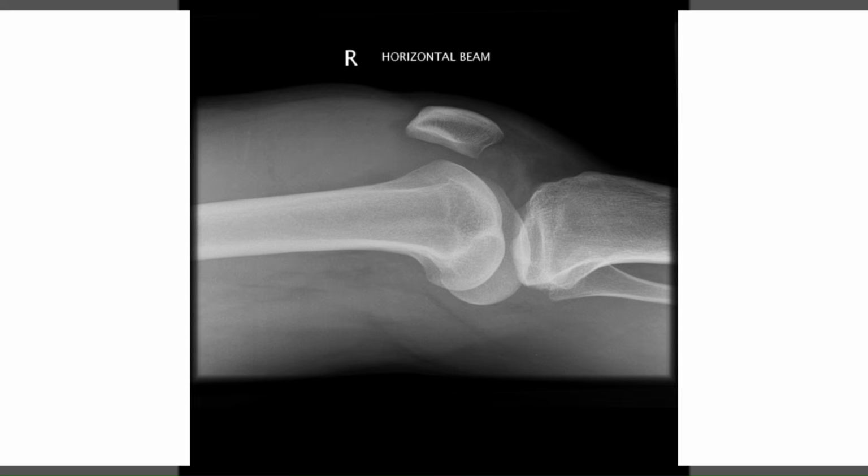So let's do a couple of examples. You're in X-ray rounds and this X-ray comes up and they ask you to read it. Well, what's our 3-part framework? The first part, is this an AP, lateral, or oblique? We call this a lateral. Is this a kid or an adult? A skeletally mature knee. So, lateral view of a skeletally mature knee. And your first sentence is done and you're well on your way to impressing the guys in charge.